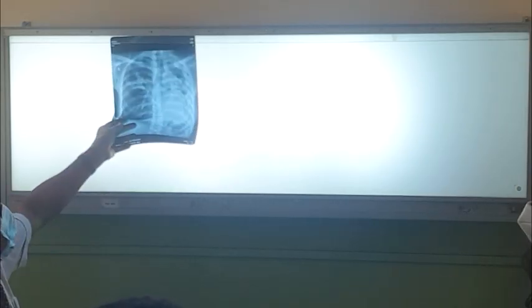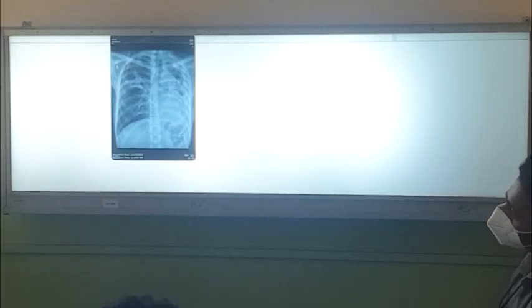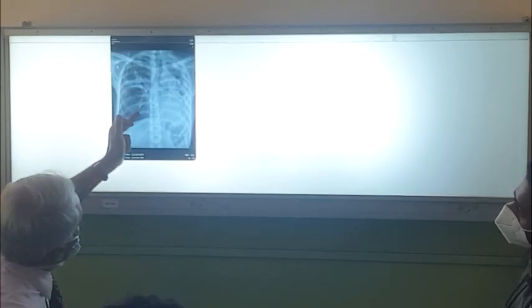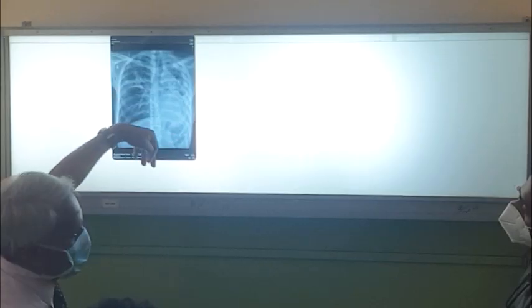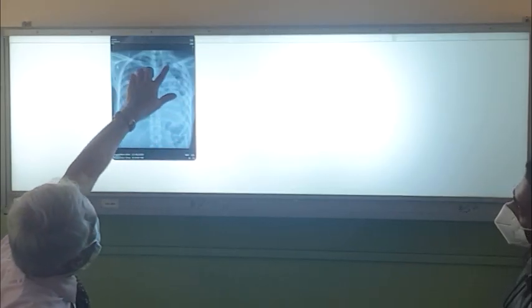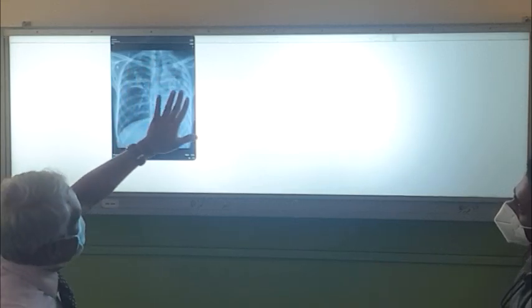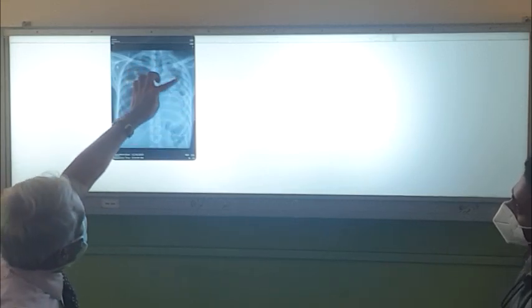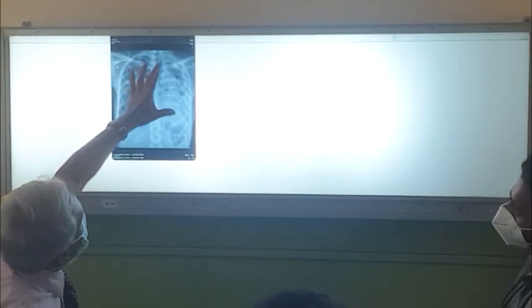Right. Again, a post-TB patient, but a lot of things you can see. So on the left side, now you can't see the cardiac shadow here, it is shifted there. You can't see the hemidiaphragm, you can see the descending aorta. So everything whitish with a dark area suggests a cavity. So it's a fibrosed left lung with a cavity, right? And the trachea, because everything collapsed.